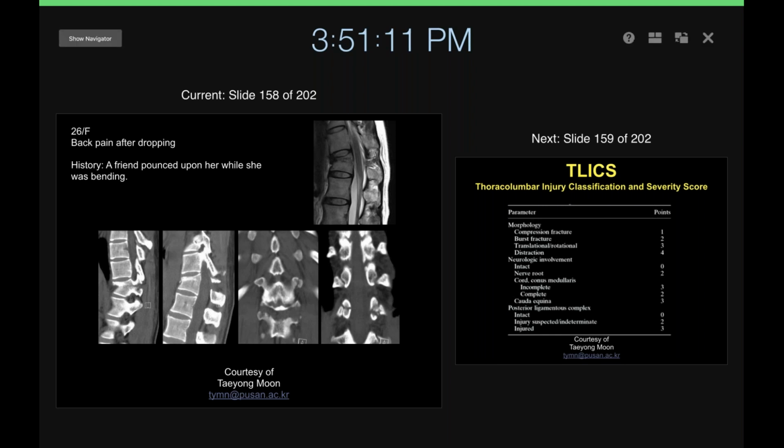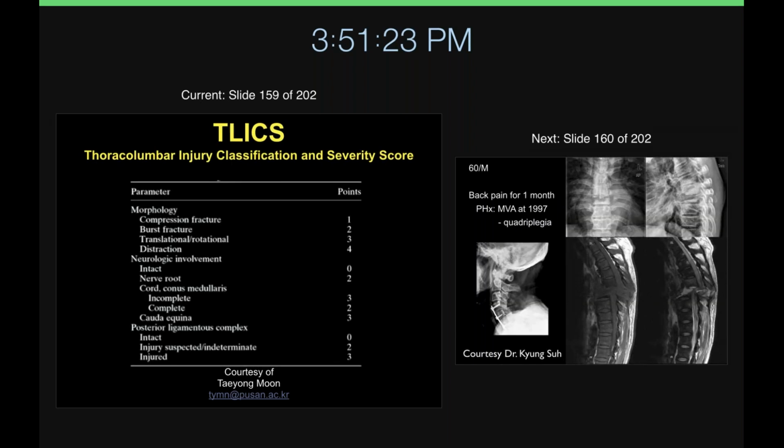So I am not sure whether maybe there's some posterior elements that are also involved. So maybe another chance fracture. Yeah, and this is more of a compression flexion type mechanism, but still it does the same kind of fracture. Now, if you get out and you see trauma, then you'll need to work with your neurosurgeons and see how they like to classify it.